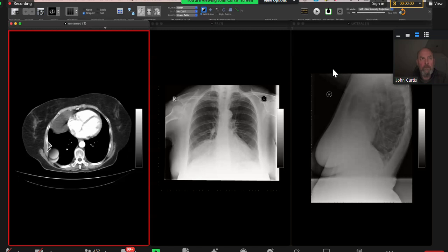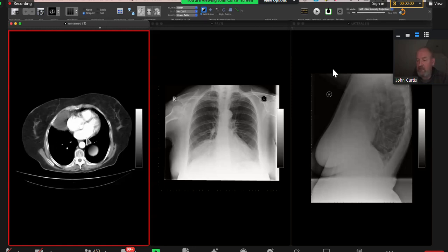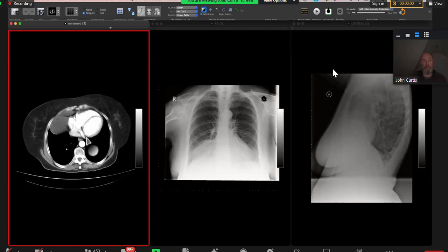Okay, so as I've explained the findings in the X-ray, there's an anterior mediastinal mass. What's the density of that mass? It's a fluid density. What's the differential diagnosis, at least? I would like to measure the HU as well to confirm my findings. It had a Hounsfield value of about 3.